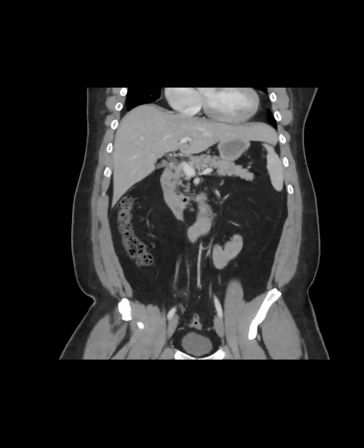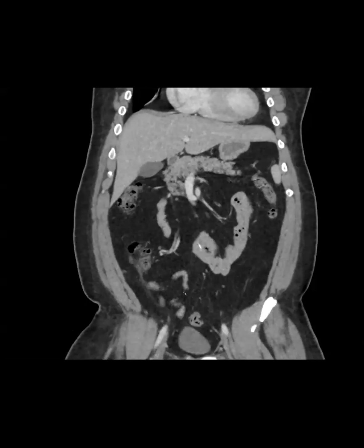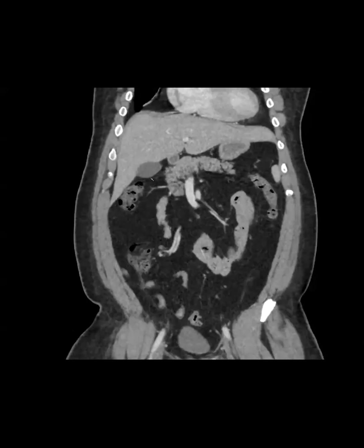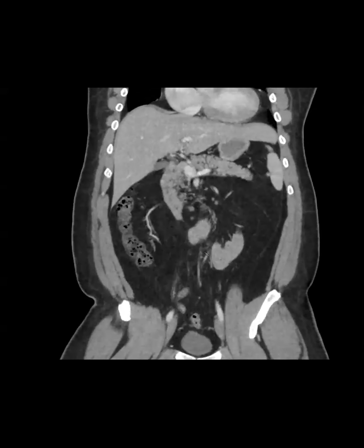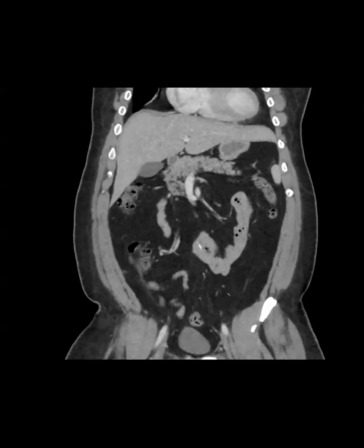So those are the two where the fishbone gets cut up. In this patient, they actually had melena and they thought that the cause was this fishbone. So they went in with EGD and they could not get down this far because we can see that it's basically in the jejunum. So they couldn't get this far. Then they went with a small bowel enteroscopy and they still couldn't get the fishbone.